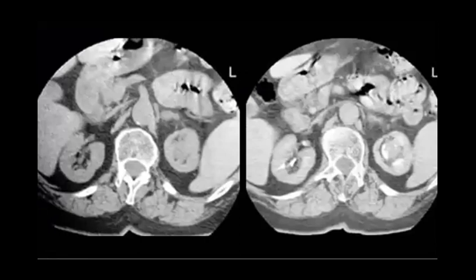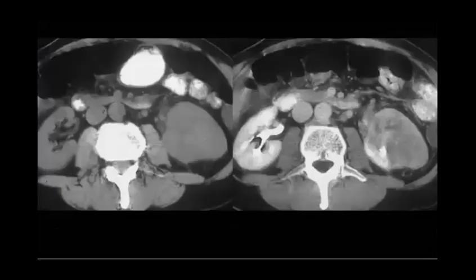Again, it can be in the kidney, so it is in the pelvicalyceal system. It is again transitional cell carcinoma. Have a sign when you see the kidney like this. When you don't find the central sinus, there is absence of the central sinus here, and there is some stranding that you should comment on in your report.